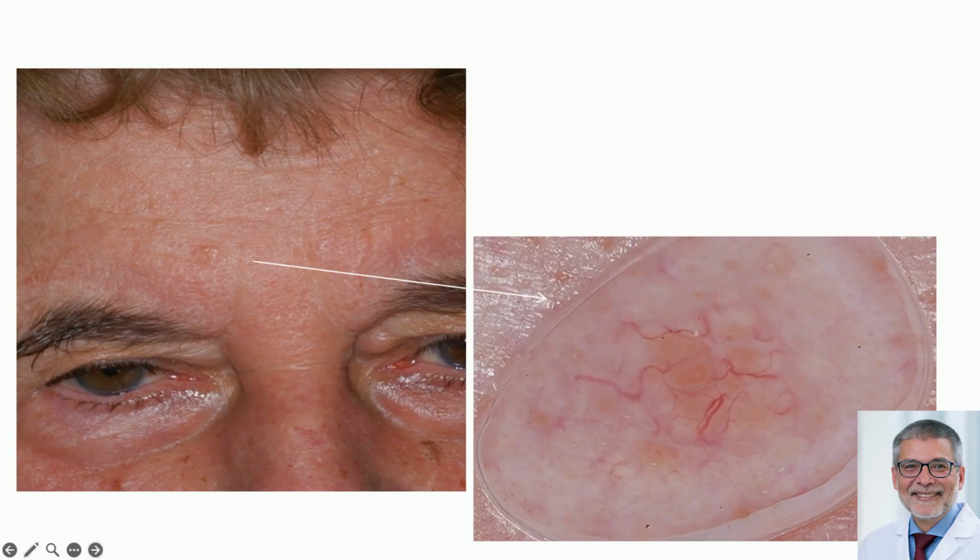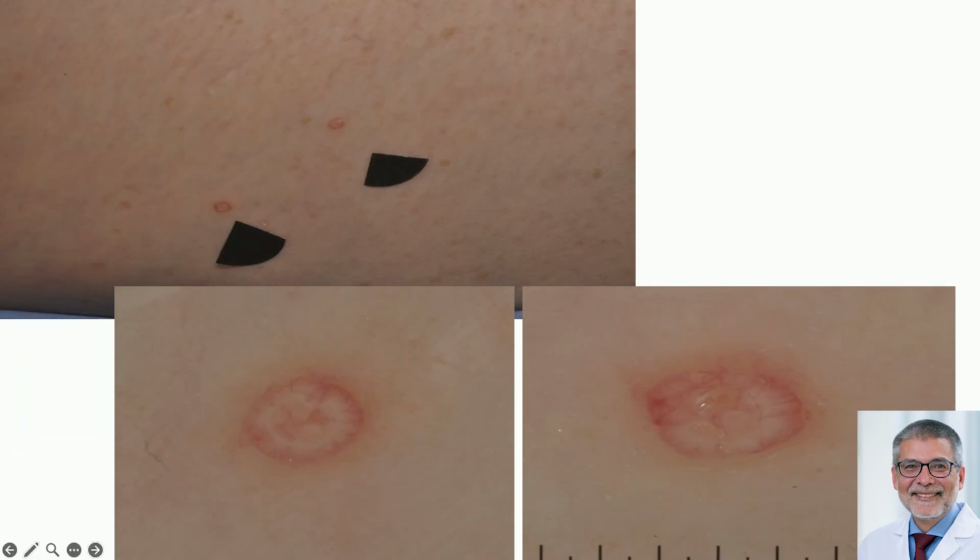There is one other entity that can have a pattern similar to this, and that's molluscum contagiosum, okay? So keep that in your differential when you see this pattern.